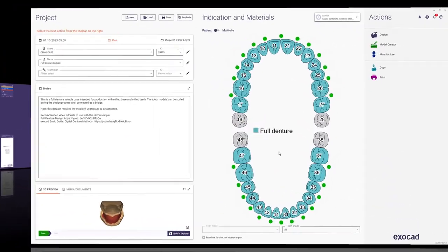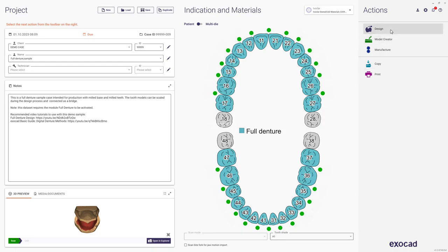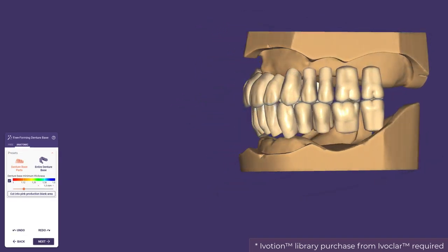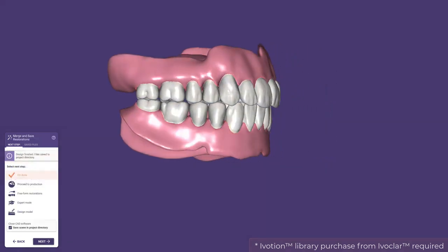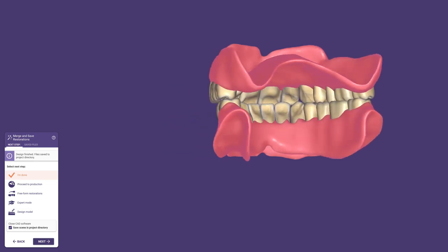In addition to the denture model, the Ivotion denture system is now available to all our resellers. A workflow designed for using a unique shell geometry disk that combines both tooth and denture base material in just one blank and milling process. Just ask your reseller for this exciting module and contact Ivoclar for the tooth library and system requirements for production.